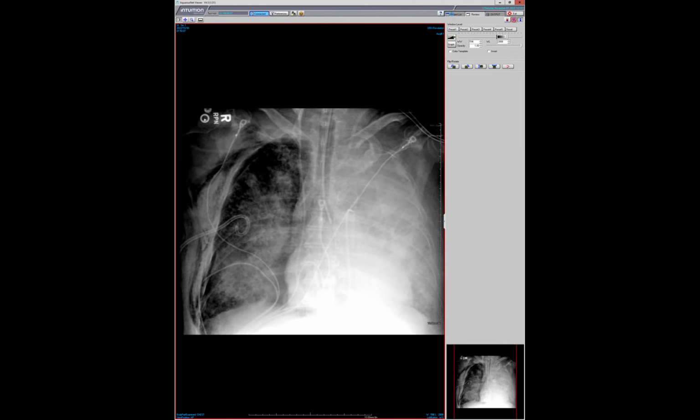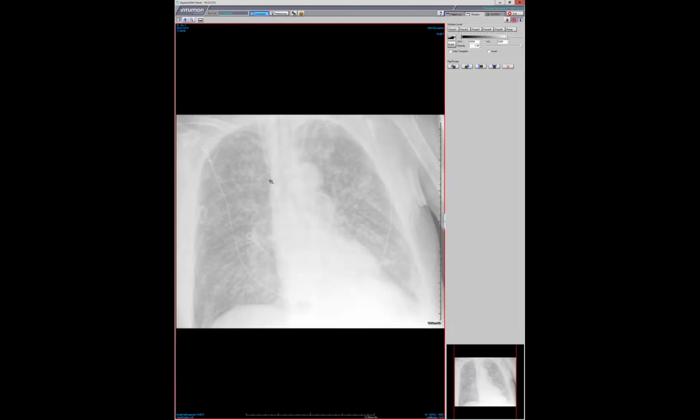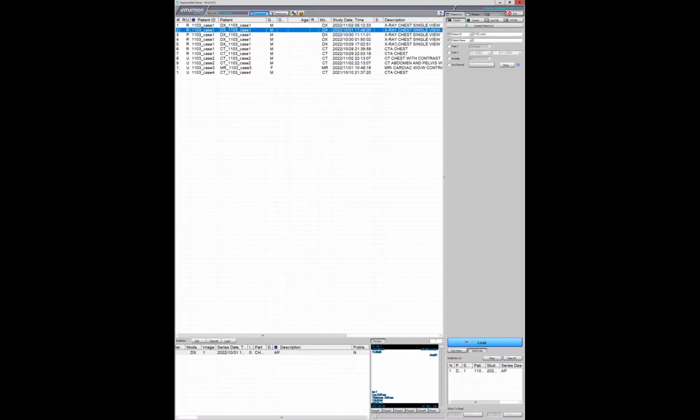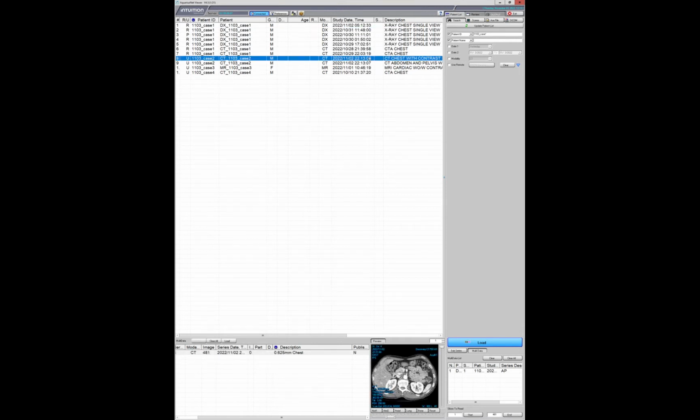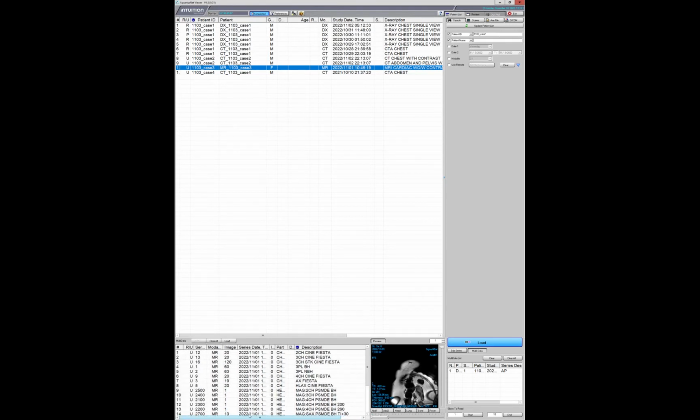I was just shocked at how quickly the lungs cleared. This is the next day from those completely consolidated lungs, and now he just looks like he has edema again. Anyways, I just thought that was kind of cool. One can find descriptions or reports of that if you do an internet search for the white lungs of ECMO, with ideas about why the lungs become white. But I think in a substantial number of people, it's just that they ventilate them at very small tidal volumes.